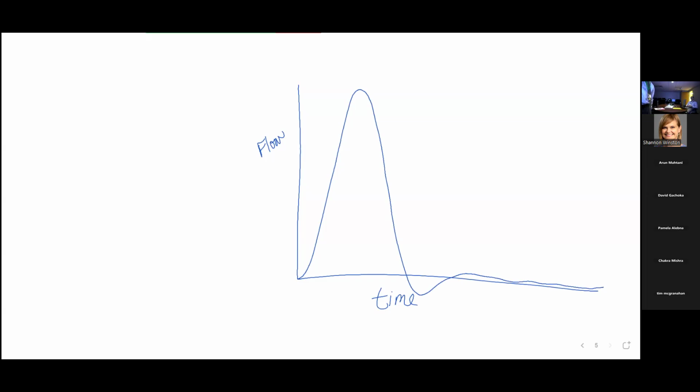And basically, in order to calculate, you're going to have images. Let's put our little images down here of the aorta. This is the ascending aorta. We're collecting these images over time. We go all the way out here.